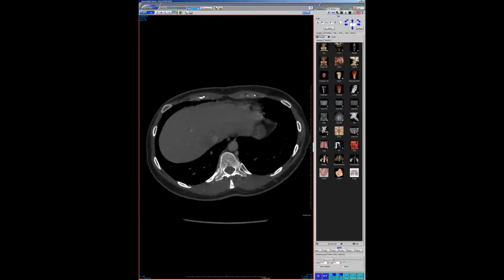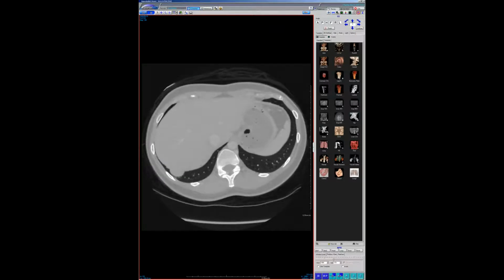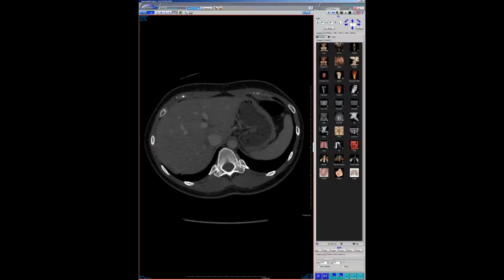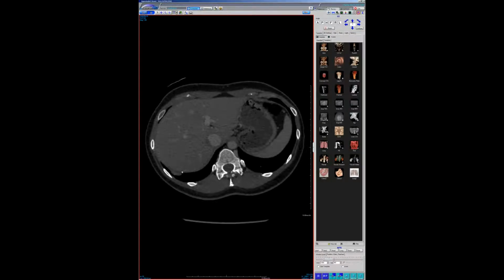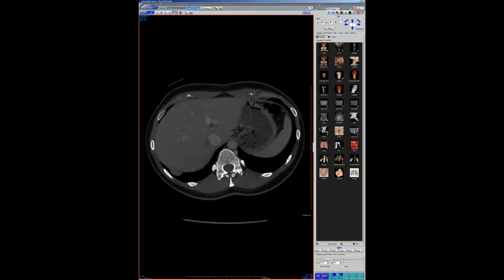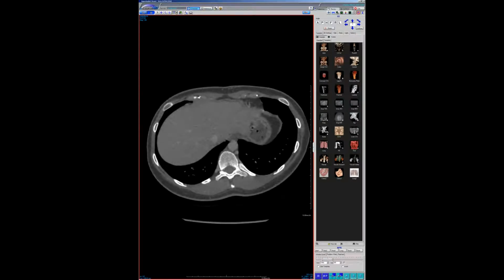I haven't seen one of these in a while. Usually the implants are below the resolution of CT. That's impressive. Exactly, I've never seen them that large. Well, we said to definitely go for a biopsy, or at least have someone put a scope in there and look. Initially I was wondering, is this some sort of hepatic herniation? But there are just a lot of them, and it just didn't make sense. So yeah, you're almost certainly right. It's really impressive because it's on the right side. The history fits.